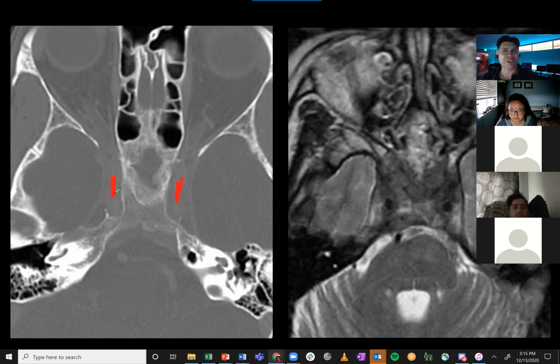Are these normal cavernous sinuses? No, they're not. And why are they not normal? They are expanded. They're too thick, right? That's big. Right. The cavernous sinuses are big on both sides on the CT. And what do you think about this sinus air cell compared to this? Looks like compared to the posterior ethmoid, the sphenoid is just completely effaced. And there's osteoneogenesis. Completely opacified. Right, osteoneogenesis or neo-osteogenesis, if speech recognition takes that better.